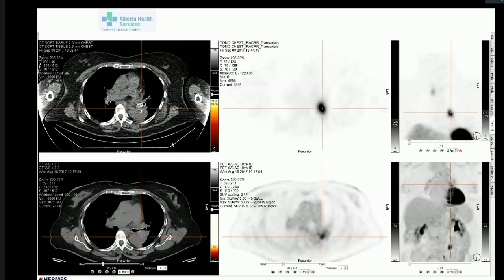So there is increased uptake. No problem. So these are multiple spot images from the octreotide scan, and the crosshairs are basically shown over here. So this is giving high uptake over here. So this is increased uptake of octreotide, and this confirms that this is a carcinoid.